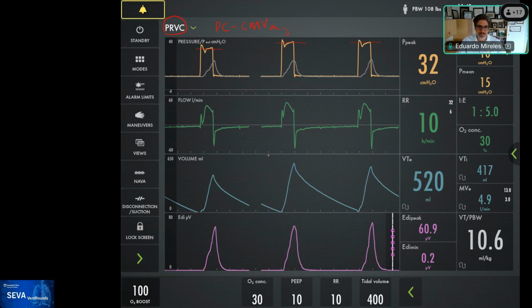Rob? That's a really excellent illustration. It also shows how quickly the ventilator responds, right? It doesn't take a bunch of breaths before it starts increasing the pressure. Yeah. The second part that I want to highlight is the reverse trigger for the patient, or early trigger, and here it becomes very evident, right?